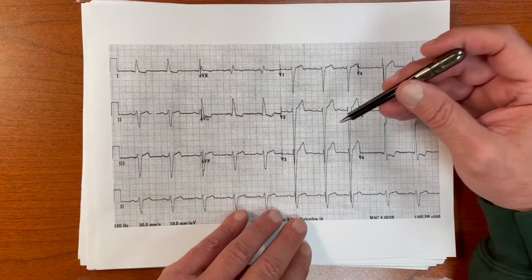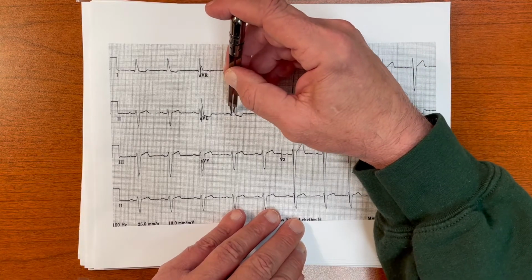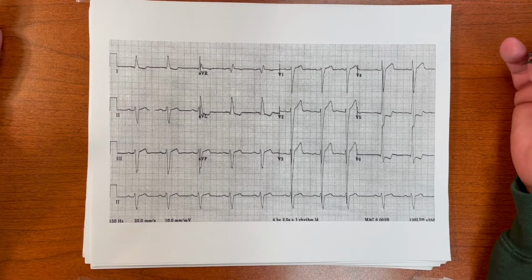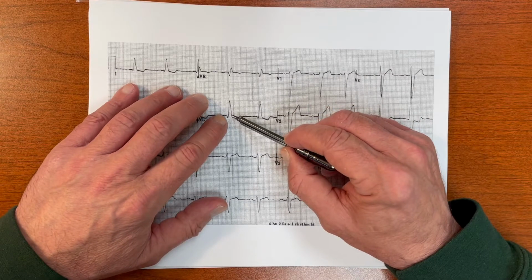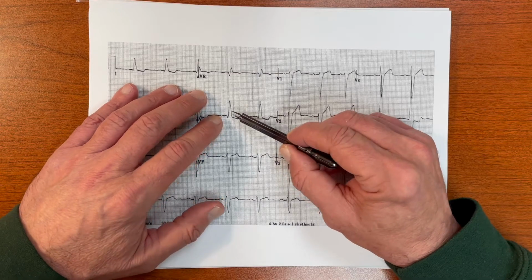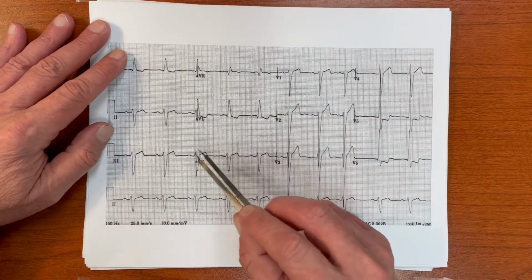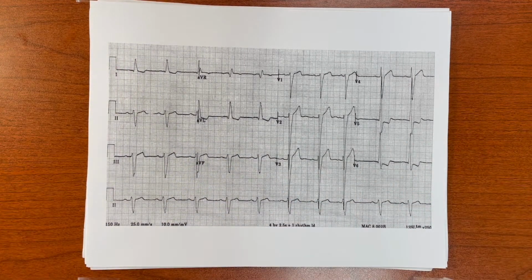And then all of a sudden, here, which this is, remember, LVH, notice how the QRS is wider. Okay, that's because of LVH. So muscle is thick. Just think about working out in the gym. You've got more muscle to depolarize, so the voltage gets higher, and you also get a type of intraventricular conduction delay that's mild. It's more than normal, but not as bad as a bundle branch block typically. Notice also, we had talked about axis. With the axis here, notice it is going away from the inferior leads, okay?